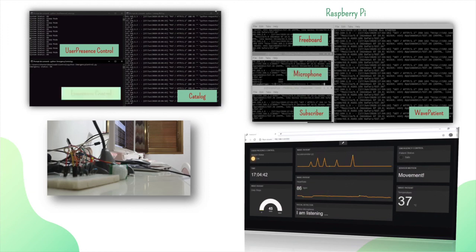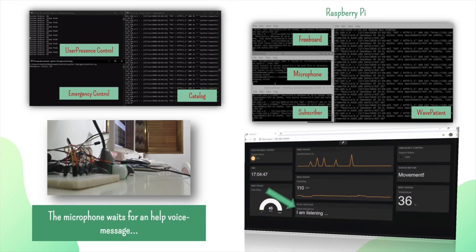The last device to present is the microphone, and it has a crucial role in the emergency system. This device is always on and ready to call the emergency status if needed. If the help message is detected, as before, each component changes its status.